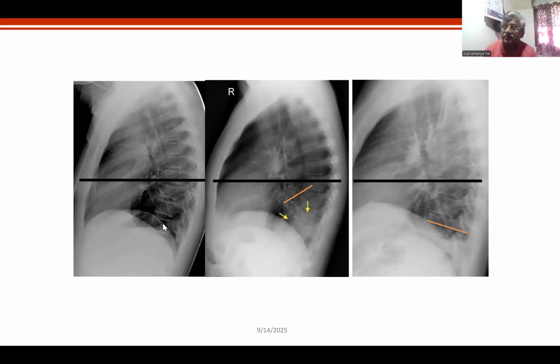Did you understand? Why it is more radiolucent down is not because the spine is more and more radiolucent down. It is because the lungs are hyperinflated. Or I would use the word, normally the lower lungs hold more air than the upper lungs, and therefore the spine becomes more and more lucent as you move from above downwards.